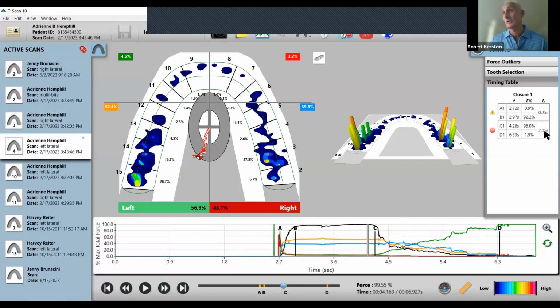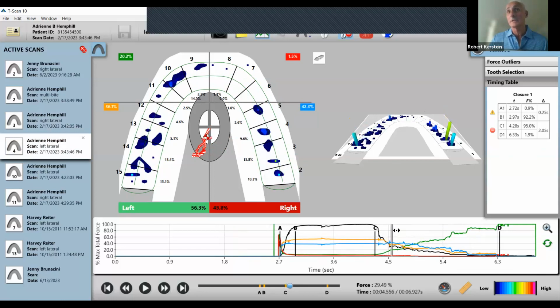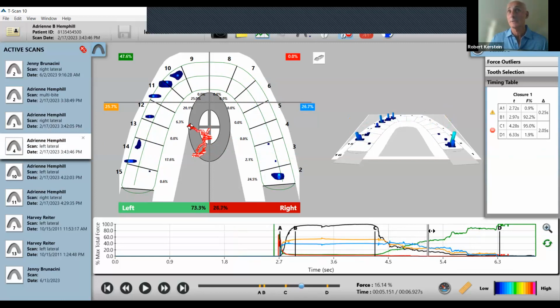Both movements are very long, 2 seconds each one, right? So that's a marker for high muscle firing, wear and tear on the teeth. You see the center of force can't go towards the anterior left quadrant. It's trying to, but it struggles between the balancing side and the working side remaining molars, right? So this is a very dysfunctional graph that clearly shows that she doesn't disclude well.